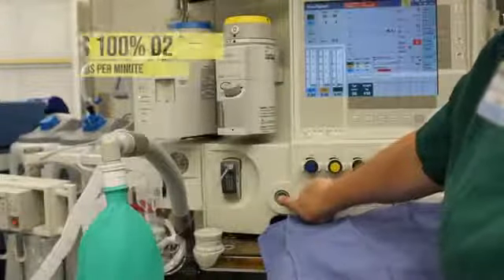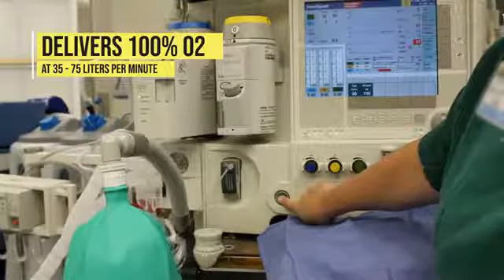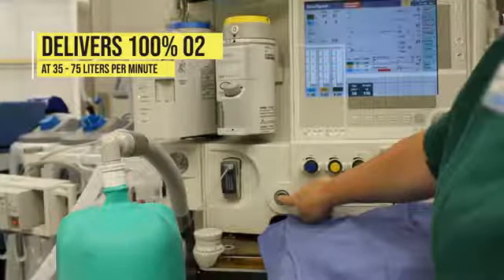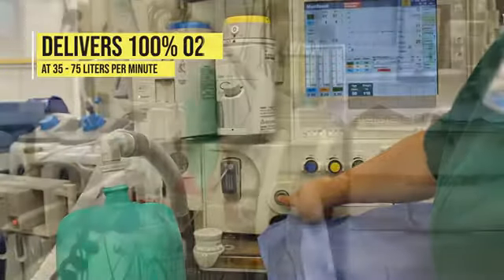The O2 flush valve is operated by pressing a button and allows for the immediate delivery of a large volume of oxygen into the circuit. This is always 100% oxygen that bypasses the vaporizers regardless of their setting.